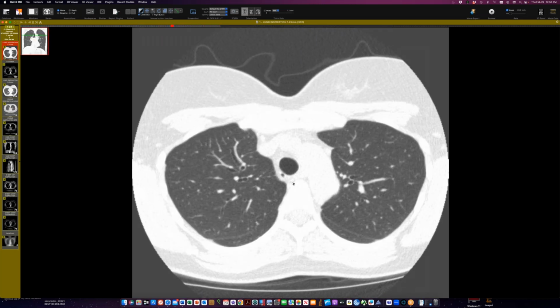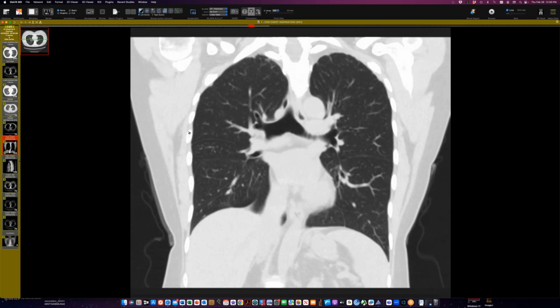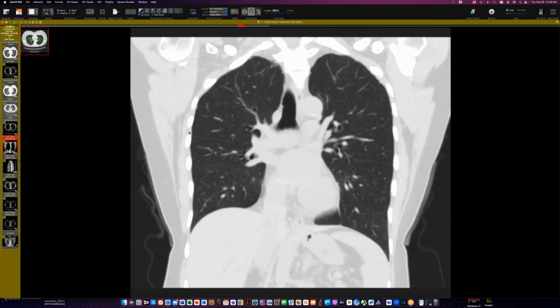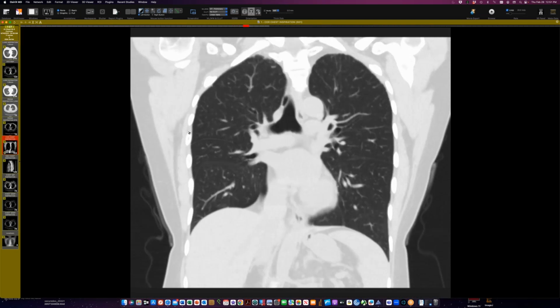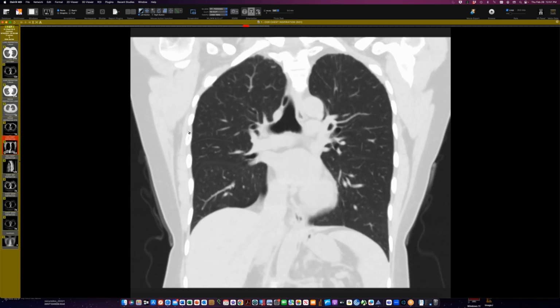Right, and the diverticula have either an invisible or slit-like orifice, and then you have a bigger space. Yours is too tubular to be a diverticulum. So yeah, I would call that a blind ending tracheal bronchus, or aborted tracheal bronchus. Okay, very good.